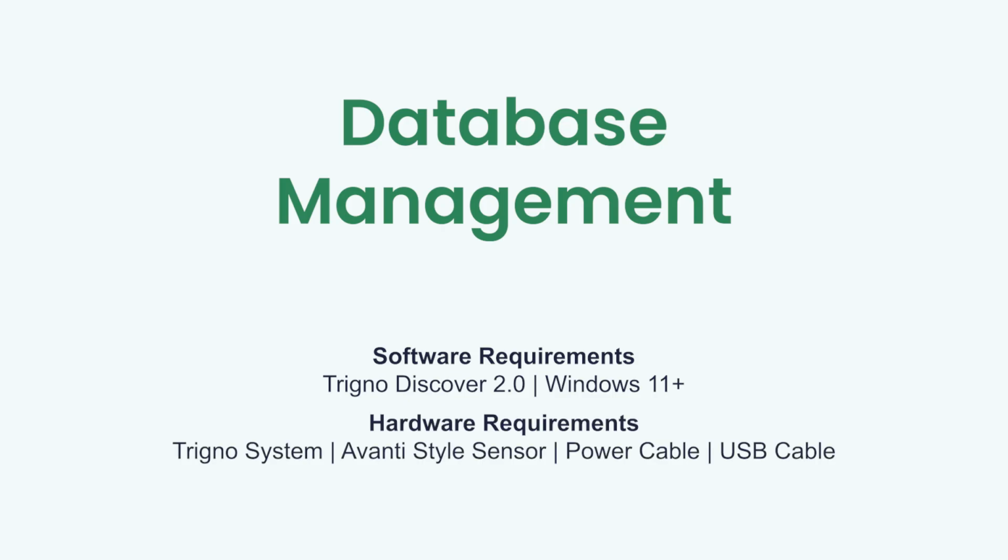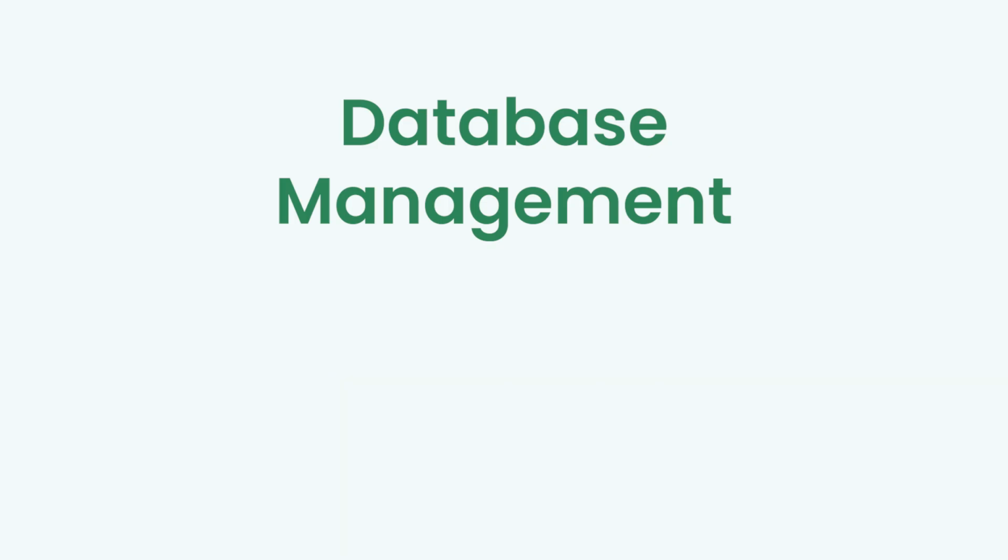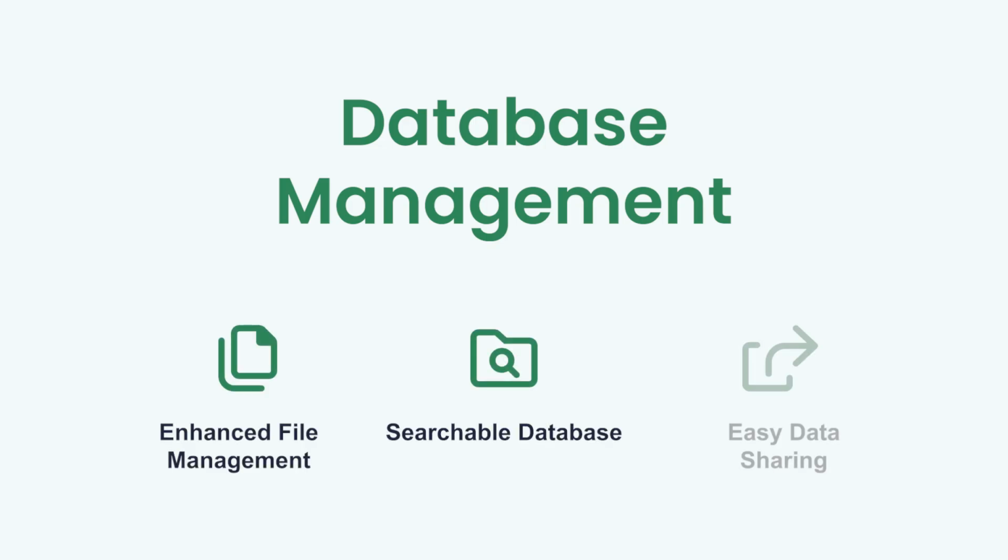This video will provide instructions on how to set up and use the database file structure within Trigno Discover. Trigno Discover 2.0 introduces a new database system for file management and storage. This allows for all Trigno data to be stored, tagged, and filtered within Trigno Discover.